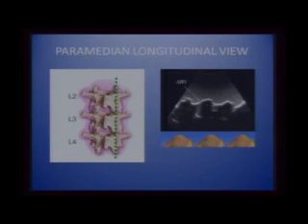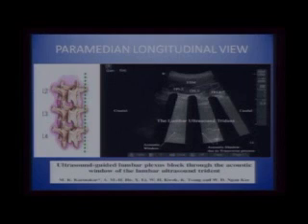So ultrasound for the spine actually refers to a lot of animals and animal parts. When you pick up patterns, you say camel humps, heads of galloping horses, frog's eyes. You also have cat's whiskers and bat's wings and so on.